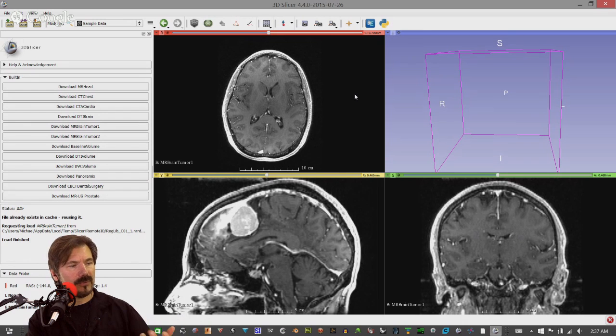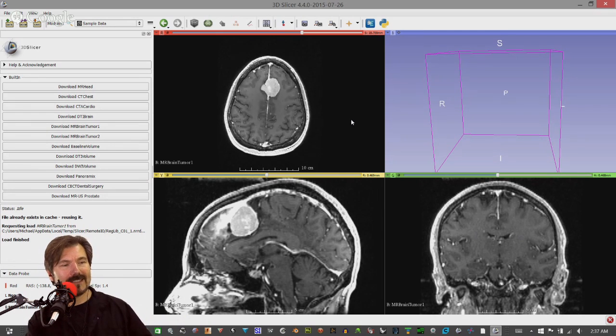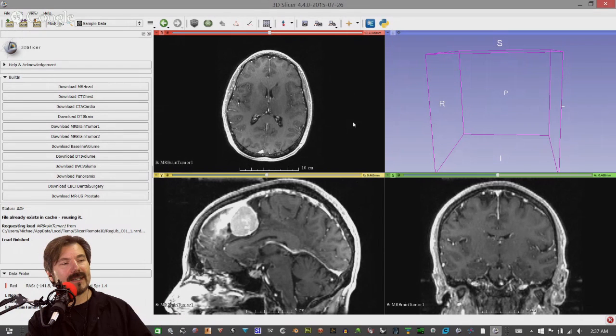And just to go through the controls of these particular positions, you can use your scroll wheel to go through the slices. Now keep in mind that DICOM information can be based on either a single slice or multiple. The strength behind CT and MRI is the ability to literally create images based on a three-dimensional location in the body, as they call it, slices. And they're layered together, one after the other. So the scroll wheel here is pretty powerful because it allows you to scroll very quickly through the different slices.